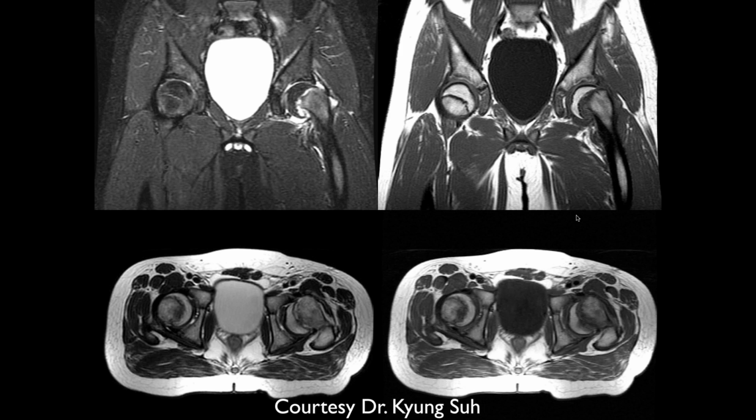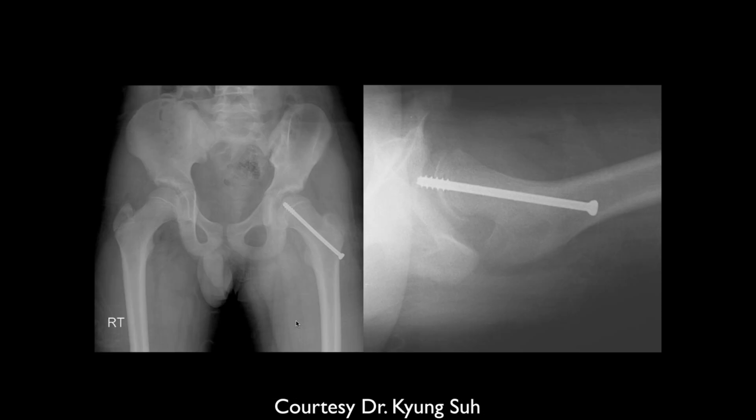And then on the MRI, we can see that as well. There's a joint effusion, significant signal within the epiphyseal plate, and then it's angulated posteriorly in relation to the distal aspect of the femur. Here you can see the normal on the right and the abnormal on the left. Yeah, so that's pretty clear. And now it looks like he got pinned, and it appears to be in better alignment. It still looks maybe slightly off, not exactly 100%, but much better alignment than before.